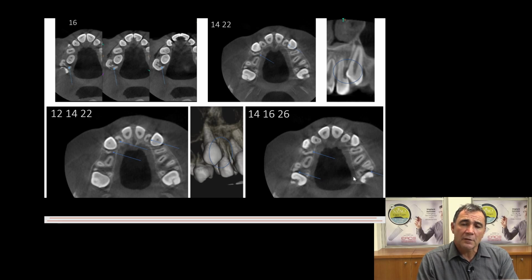And then lastly, if we look at the 1-4, totally destroyed almost, the 1-6 almost totally destroyed, and so is the 2-6. You can see the relevance of the information that I can give through to the orthodontist, because from this we can change our treatment plan completely. We do not have to guess how much damage there was to the underlying teeth. And with a proper orthodontic workup, we can plan for implants in adult life.